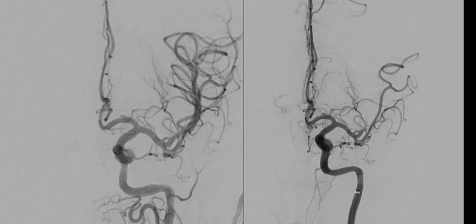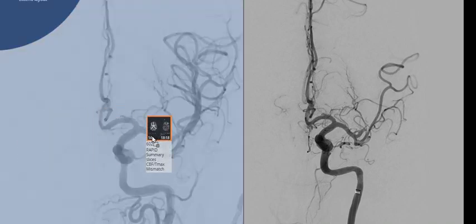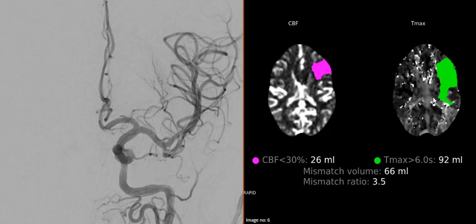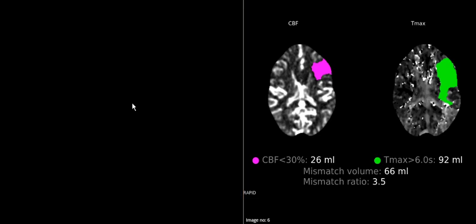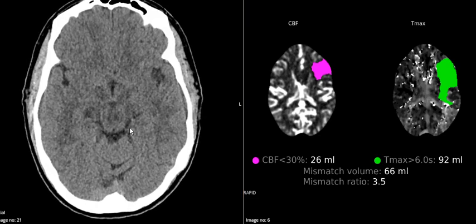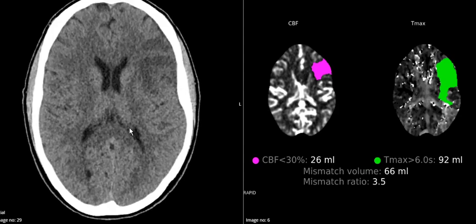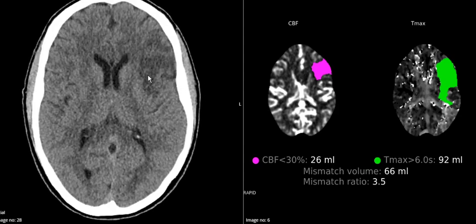So let's get back to where we saw the summary of images, which tells us this is the vicinity of left mid-cerebral artery. And let's look at the next day brain. Should be about here. If we get up to the same place, it's very subtle changes of density here. So this bit of brain is more like CSF, more water here than there, and different to there.